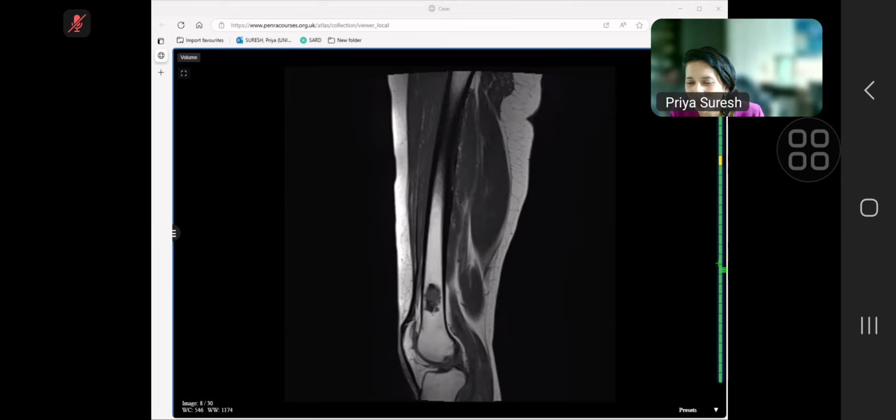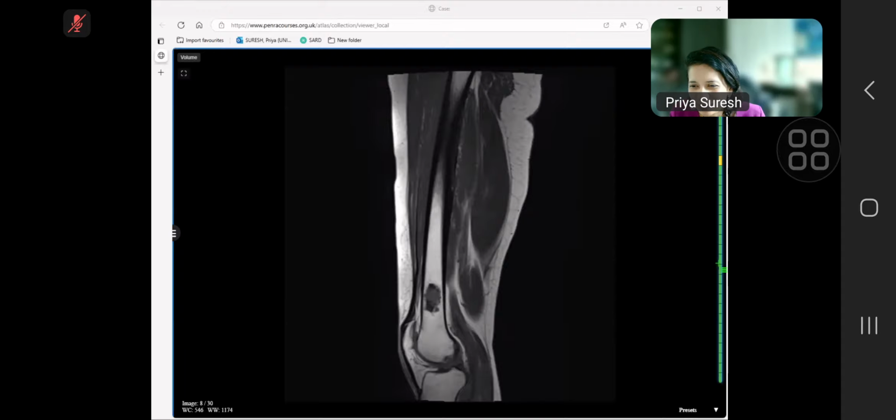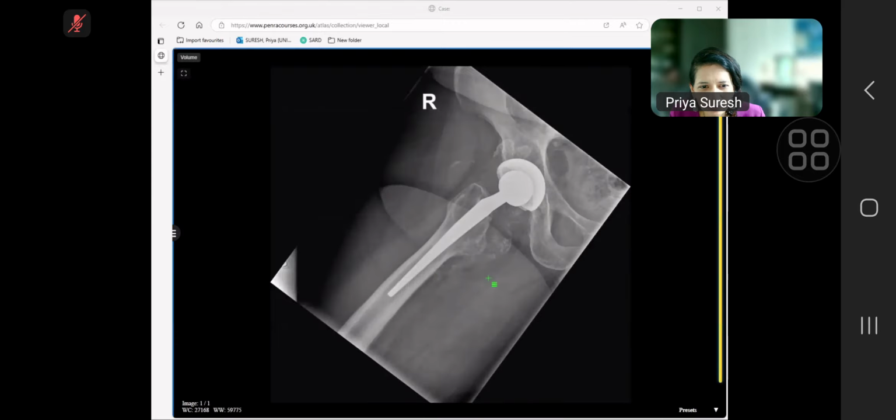Okay. So the next one, case 5. This was a tricky one. And again, you didn't ask me for another view, isn't it? Because you have this view and it shows all this is happening here, and this tumor-like mass coming up here. Now, for this one, for everything else you said, can I look at the previous? You didn't ask for the previous on this one.